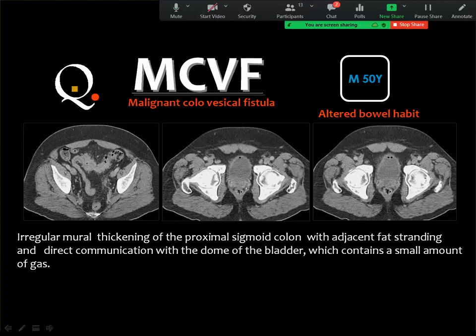And this malignancy, number one, will obliterate almost totally the lumen. Then it will destroy the diverticuli, and you cannot see in the affected segment any of the patent diverticuli, maybe one or two. Then this malignancy on top of diverticular disease can fistulate with the urinary bladder, and that's why you can see air bubbles in the urinary bladder.